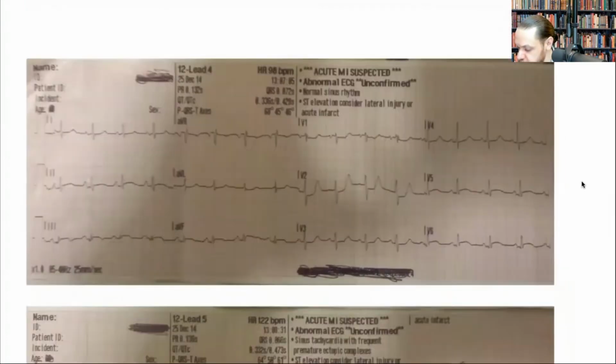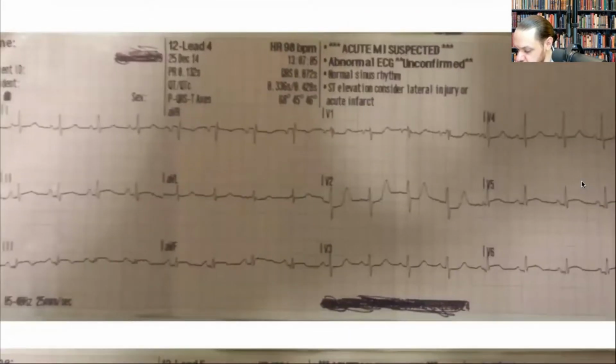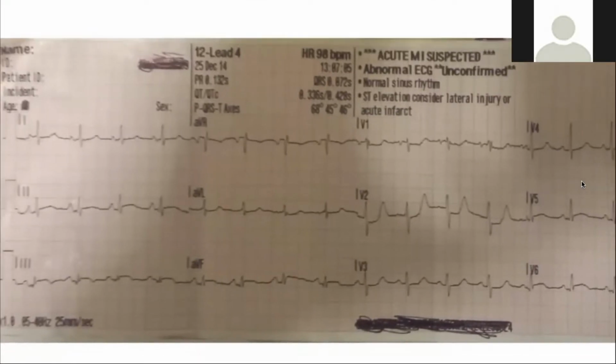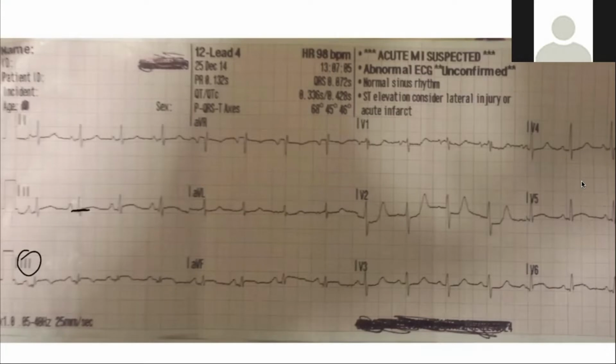This I want to show you. This was a patient that I had, right? And this was my initial 12-lead, right? So if you look here, what you notice, I can't really see elevations. They're subtle, right? Maybe in lead 3, you could see it. But the other ones are not so clear-cut, right? You could definitely see it in V2.